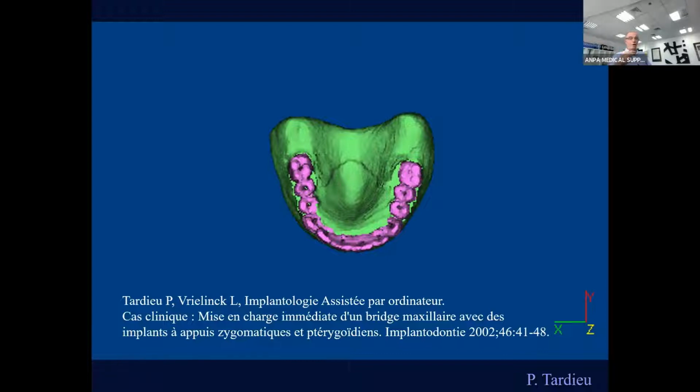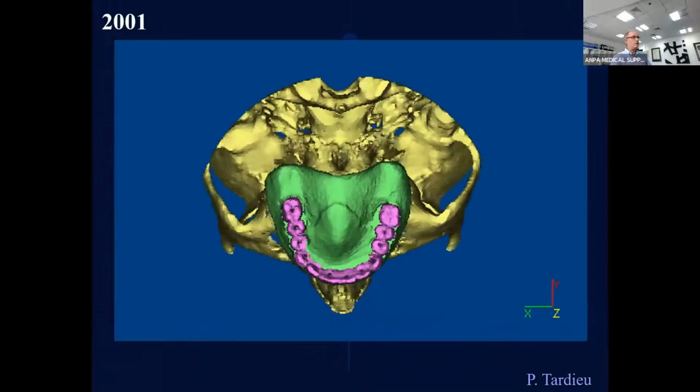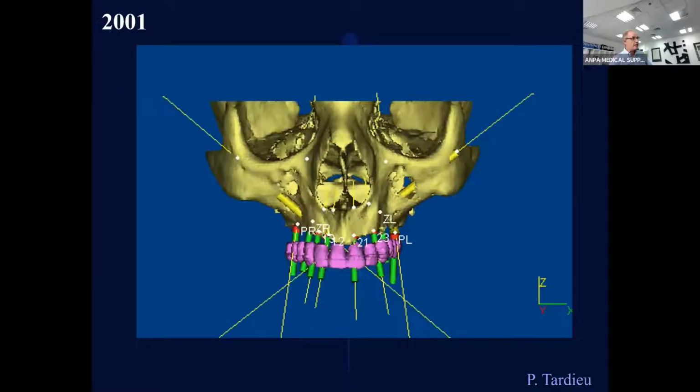So when I tell you 20 years ago we did that and that, it is because before we could not do it, as we had no solution. So we've found two solutions to work with this, and until today, this is valid. There is no issue on that. And then we have another mask, which is the mask of the bone. Based on all these masks, I can manage my case.